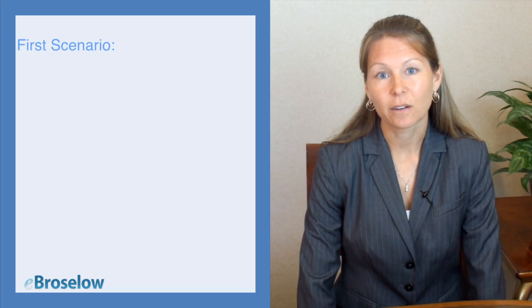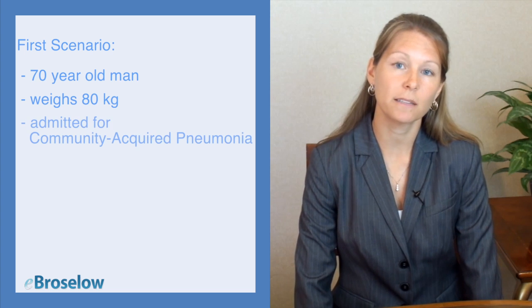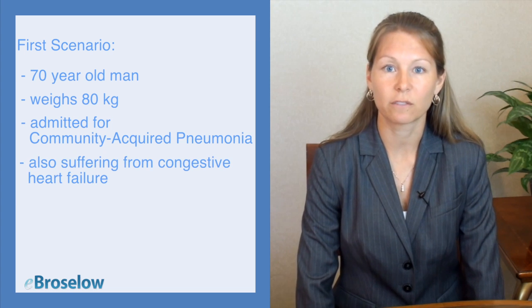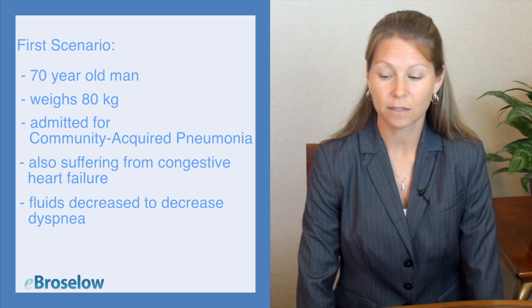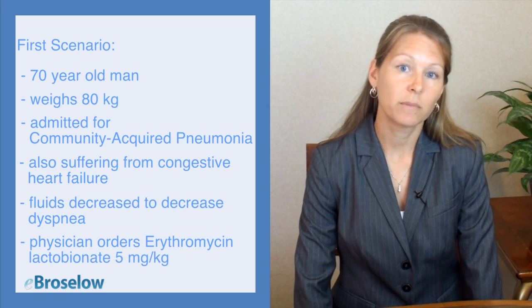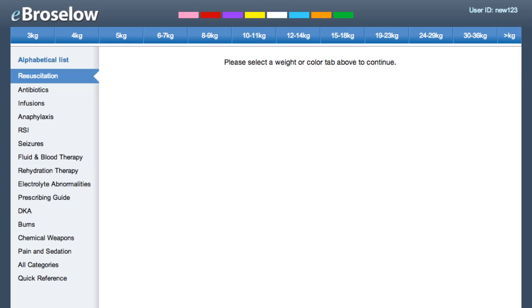Our first scenario is a 70-year-old man who weighs 80 kilograms who has been admitted to the general medical unit with a diagnosis of community-acquired pneumonia. He is also concurrently suffering from congestive heart failure. In an effort to decrease his dyspnea, his overall fluids have been decreased. You receive an order from the physician for erythromycin, 5 milligrams per kilogram, to be administered every 6 hours. We will now demonstrate how you will use eBroselow to administer the medicine.